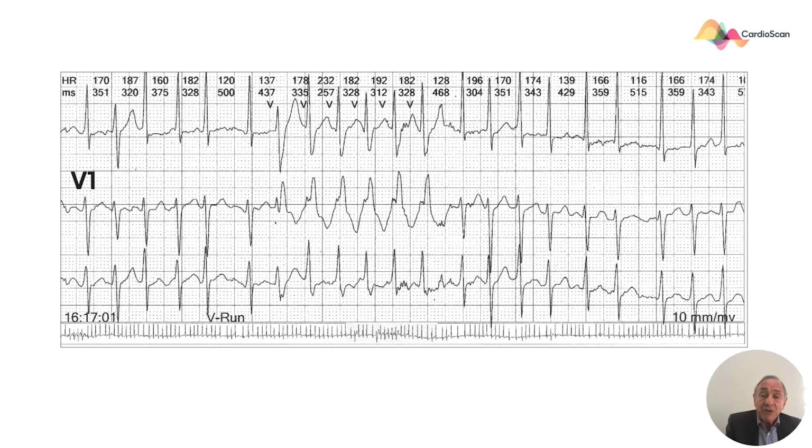Let us look at an electrocardiograph. This is a Holter monitor recording. It is an obvious rapid heart rate. As you can see there, it's irregular and it's atrial fibrillation. Centrally to that, you can see a run of 6 beats of broad tachycardia, which has been noted by the physiologist to be a ventricular run.